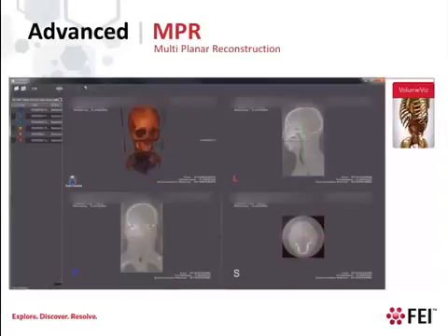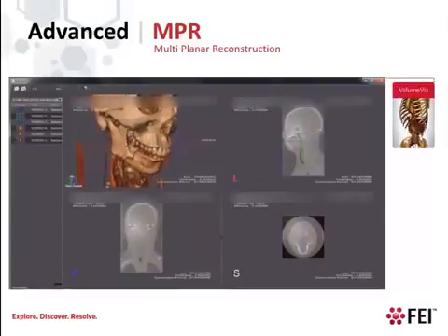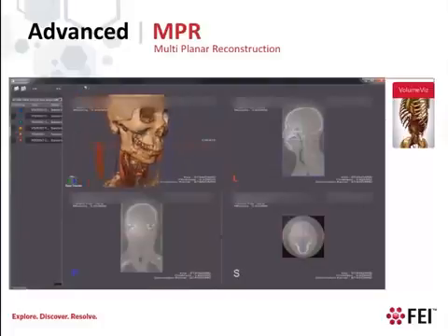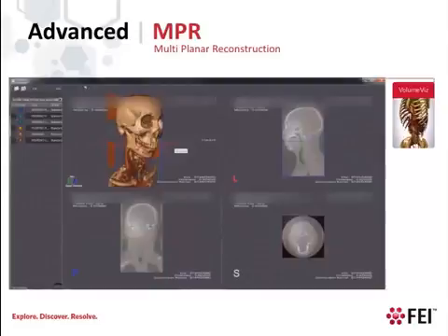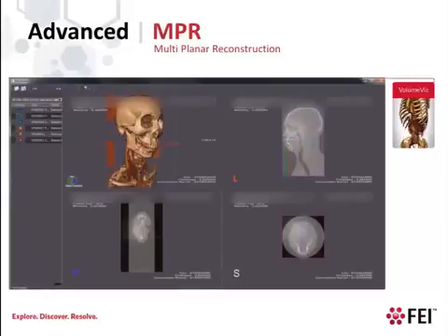Just by changing the minimum and maximum values of the data range, we can extract a new rendering. You'll also notice that the resolution increases with time as LDM loads the full resolution data. Now we can click on the volume, and the picking mechanism built into Open Inventor will tell us the position of the cursor in the volume. We'll use that information to update the positions of the corresponding 2D slices.